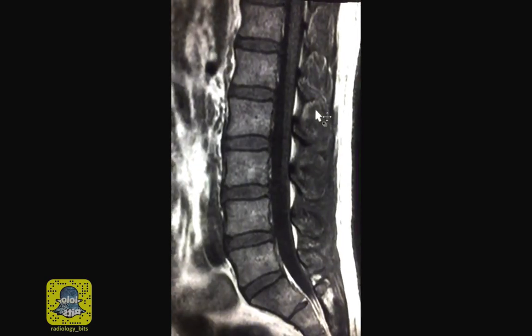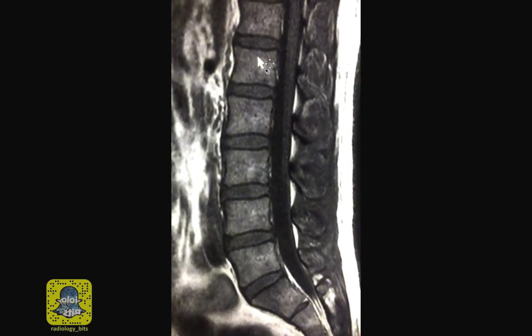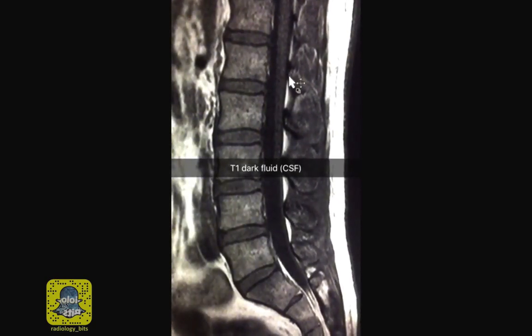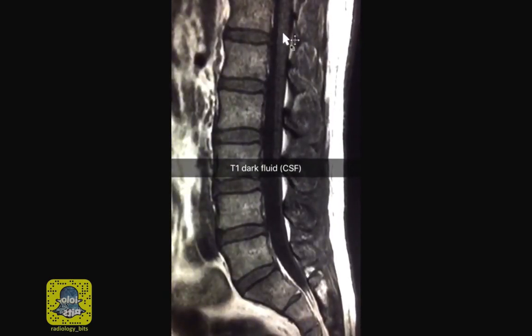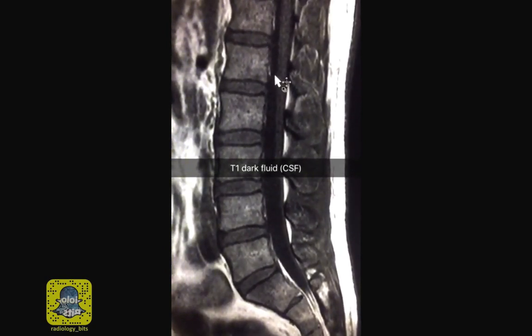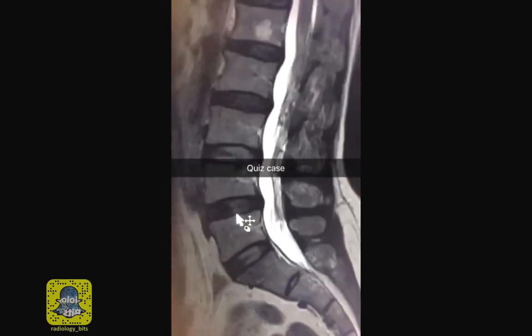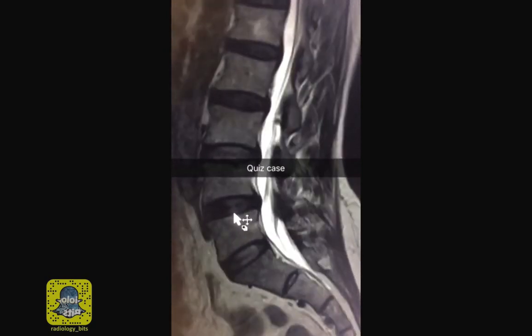Here's the same normal patient showing you a sagittal MRI lumbar spine in T1 instead of T2. Although the same anatomy applies, it's more difficult to appreciate the cord from the surrounding CSF since the CSF is also dark. Now, since we have all juniors aboard, juniors or seniors, have a look at this abnormal case.